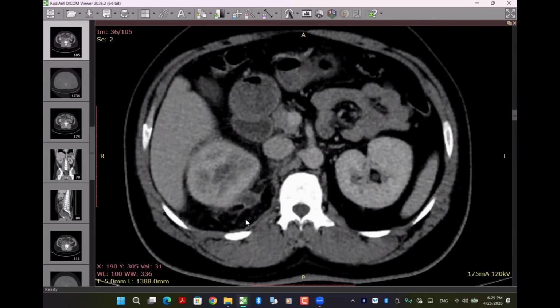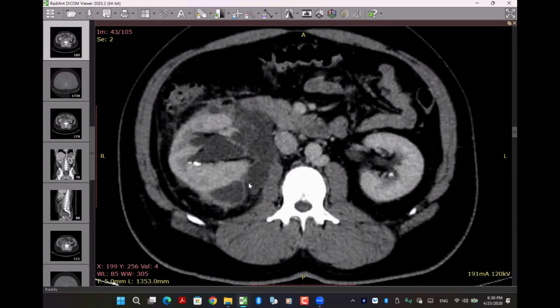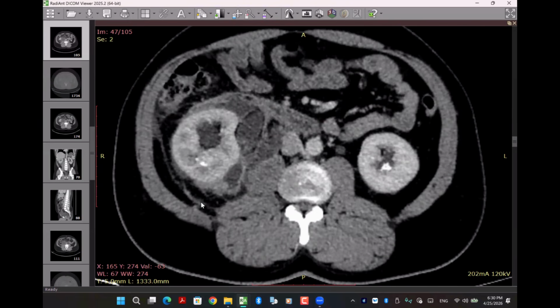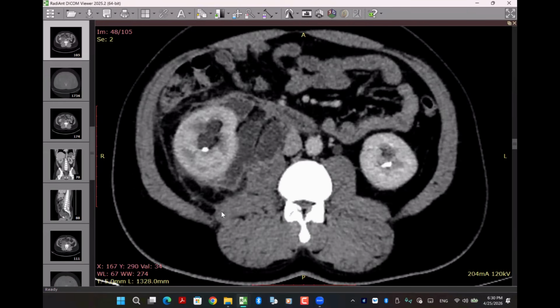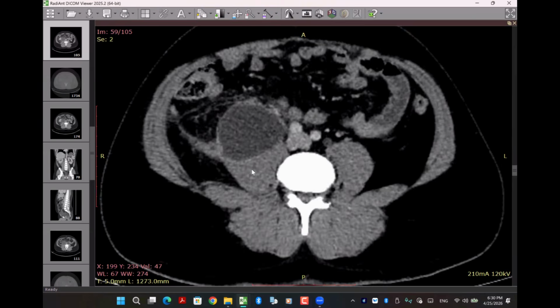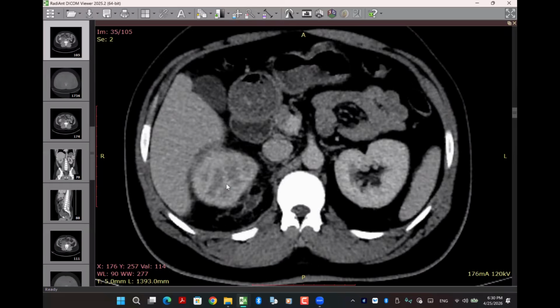You got my point? The second most important point is to check the kidney itself for coexisting pyelonephritis or even abscess formation, because this is very important for the clinician. What will I do with this case? Should I only insert a double J, or should I ask interventional radiology to evacuate this hematoma, or does this patient need a more massive maneuver to treat the kidney?